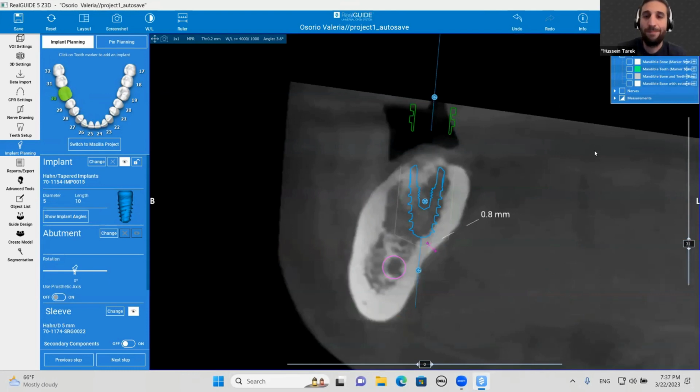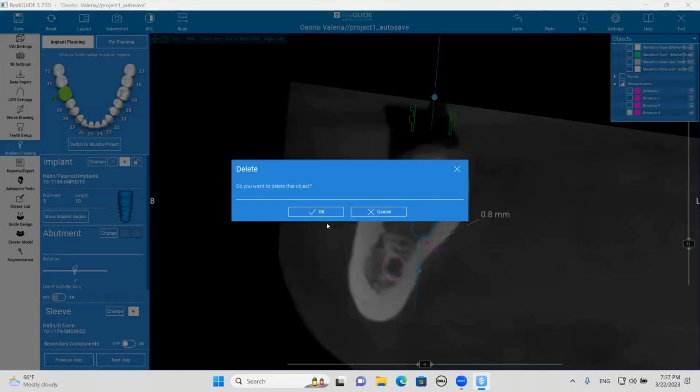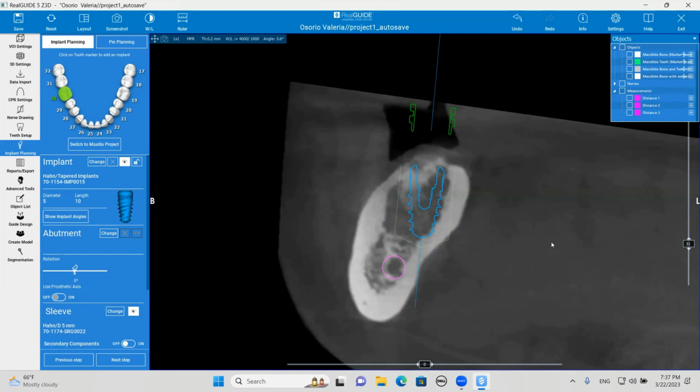Here we go, sir. Okay, so Jimmy, on this, certainly this is a bone density issue also. The thing you're going to notice on this cortical bone, when you drill right through it, is it's not going to feel real dense. See how it's slightly radiolucent? It's like a mixed radiopaque, radiolucent. So the cortical bone, even though it has remodeled, is not remodeled to the good thick bone that you see there on the lingual or on the mid facial.